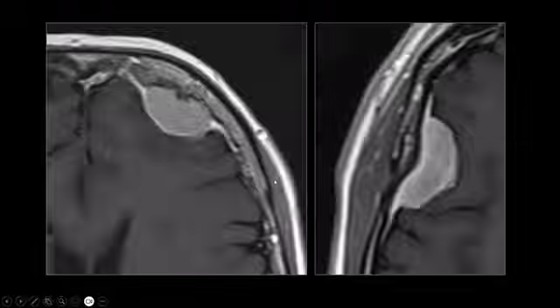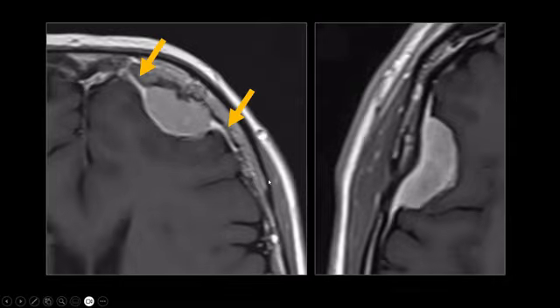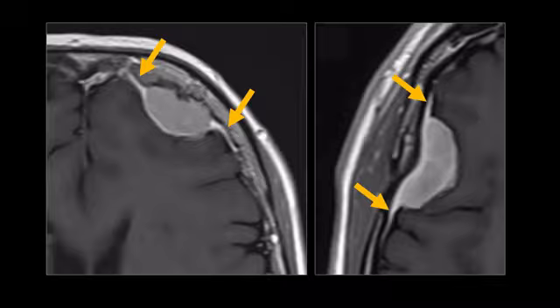So it tends to thin out. So these are two examples of meningiomas associated with a dural tail sign. Now, important to know, and you can also guess that because the intensity of the dural tail is not the same as the actual tumor, this is not tumor.